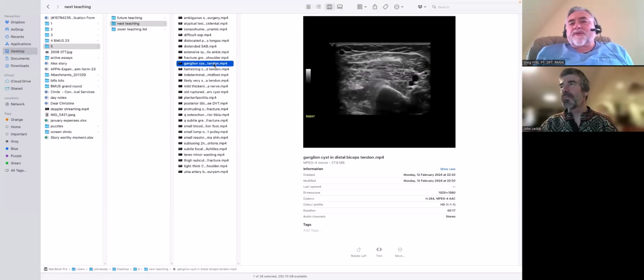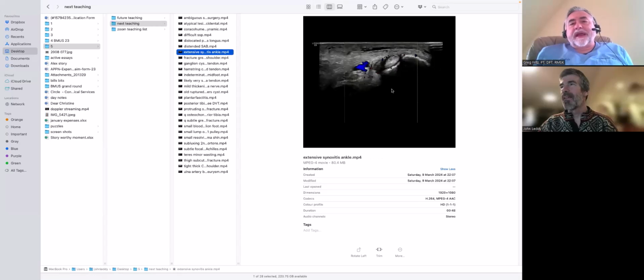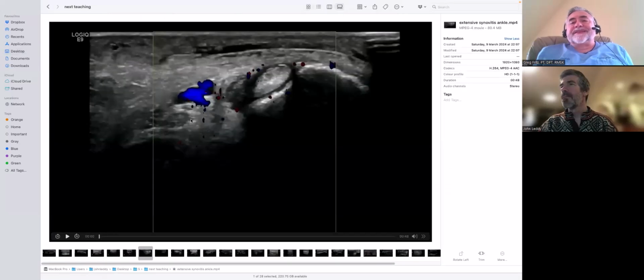John, talk me through your Doppler prep again, because you always do. And again, I think I'm looking at it and I'm seeing GE quality here. But your standard Doppler setup, can you talk me through that?